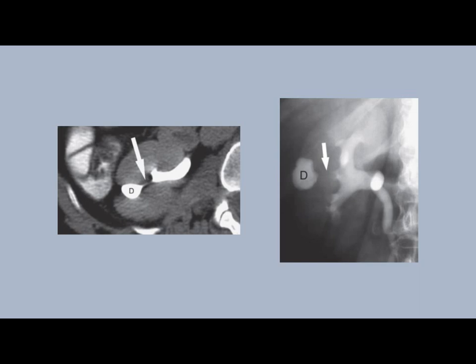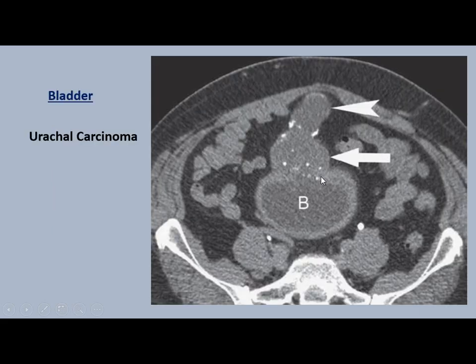Another anomaly of the pelvic system is duplication. Diverticulum. The diverticulum can be separated from a cyst, in that there is communication with the calyces, but there is a single dilatation. So this is not a hydronephrosis. Again, on a conventional study, we see a diverticulum, which is connected to the pelvic system by a very tiny duct.